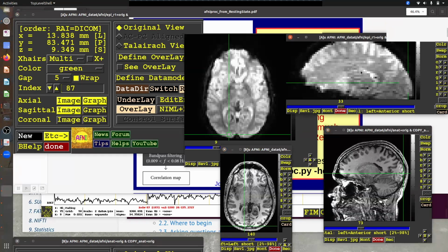this person's brain is kind of its own quirky brain, right? The motor cortex is here, the number of sulci and gyri and things like that. If you're scanning someone else, their brain has different sulcal and gyral features, and so does everyone else's brain here. If we're going to do a research study, we want to be able to click on one part of the brain and say, this is the motor cortex for everyone.